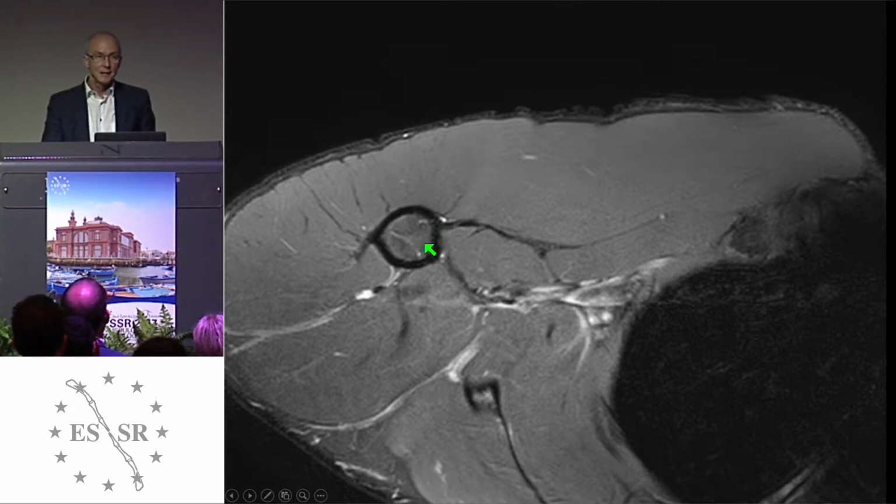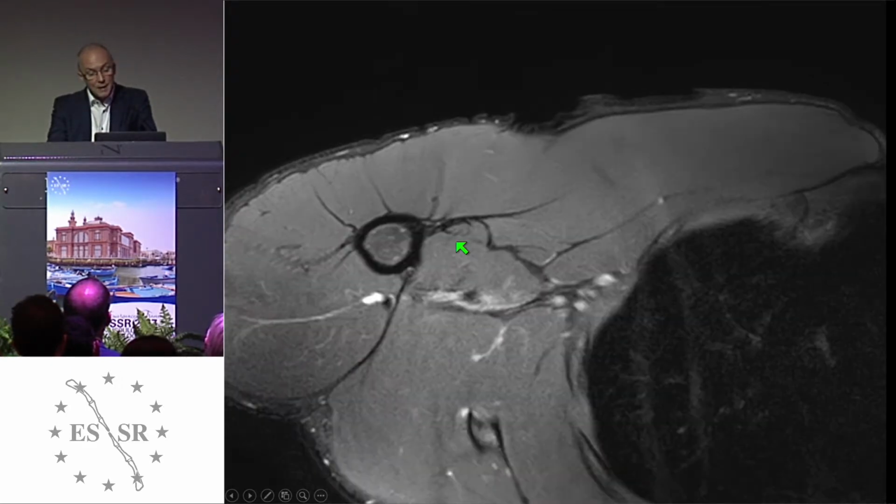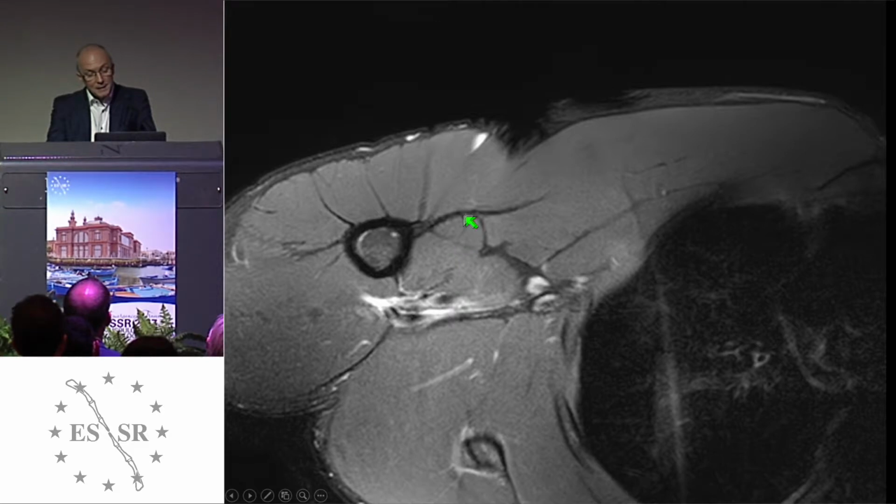The insertion site has a craniocaudal distance of about 5 centimeters, and it's very difficult to discriminate whether that is the clavicular part or the sternal part when we are going down. And definitely the best site of the insertion is where the so-called quadrilateral space is present. The axillary veins are behind and here you see the insertion site.